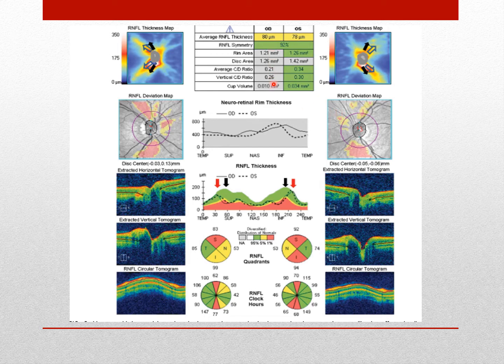The rest of the values here are shaded in gray as well. The reason for this is there is insufficient data, or not enough number of subjects, to compare it with for this optic disc size. So that's why everything here is shaded gray. And then you see that translate here gray too as well, and the neuroretinal rim.